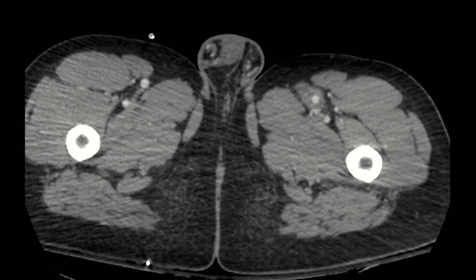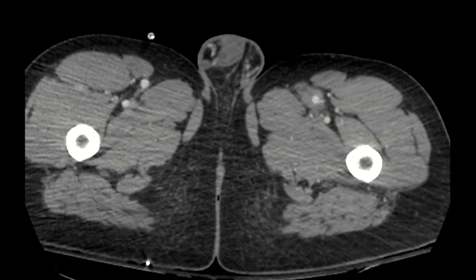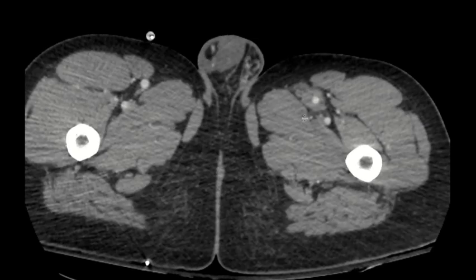And notice if I were to compare the left superficial femoral artery with the right superficial femoral artery, there is soft tissue density or periarterial stranding around the proximal superficial femoral artery. This is concerning for hematoma. We don't see any active extravasation or active bleeding, which would be signified by having contrast coming out of this vessel and kind of messily spilling out into the surrounding tissues. But if you do compare this superficial femoral artery on the left with that on the right, you'll notice that there is a surrounding hematoma.